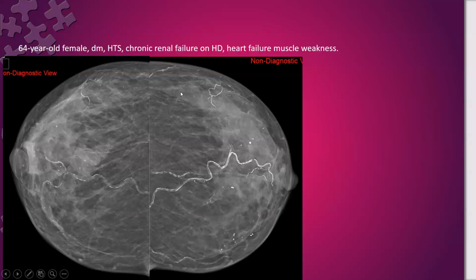Bilateral trabecular edema is expected due to chronic renal failure. But look for the fat glandular interface concavity posteriorly here. Look for the glandular fat interface here. What about this? Asymmetry. This asymmetry also. And you have some thickening associated.